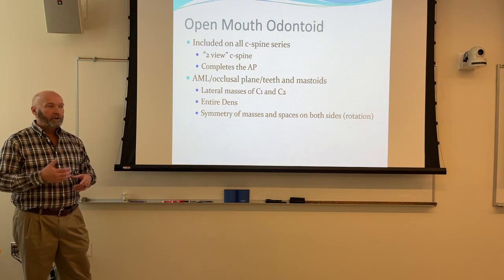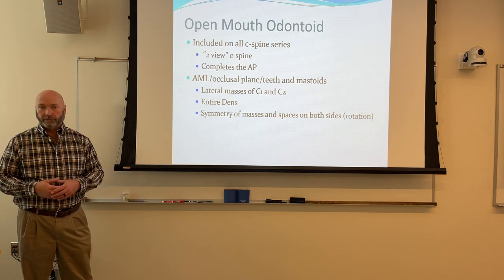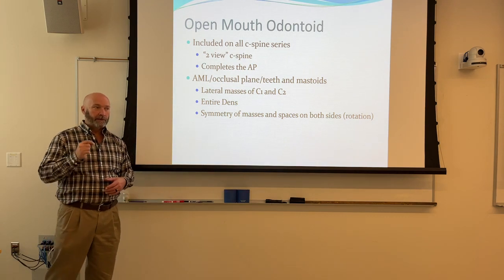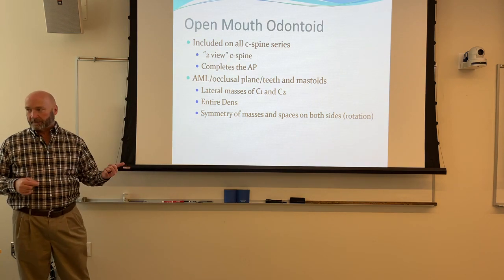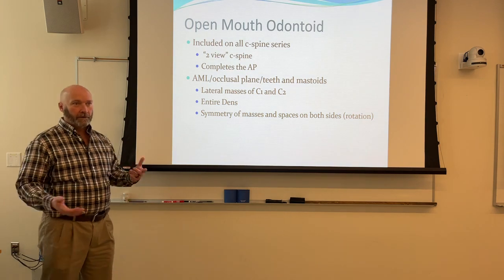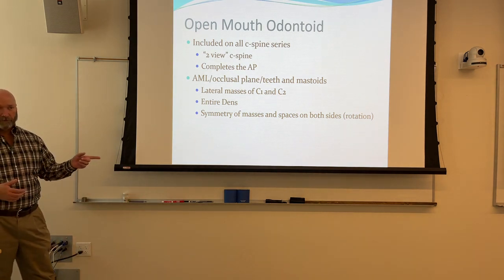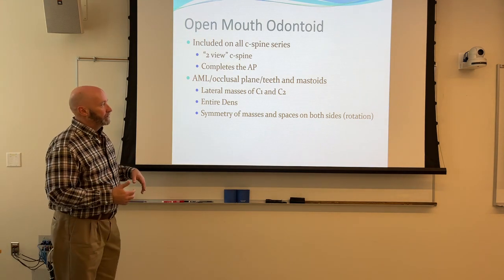So if you go to work somewhere aside from your clinical facility and you get an order for a two view C-spine that does not say flexion and extension, it's a 3-view C-spine. Minimal, at least a 3-view C-spine. AP, lateral, open mouth odontoid. Never seen anything aside from that. So hopefully your computer protocol calls for 3-view, but if you get 2-view, it's a 3-view. Okay, so this completes the AP. Acanthomeatal line perpendicular to the image receptor.